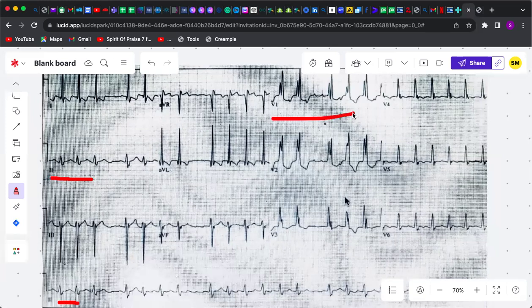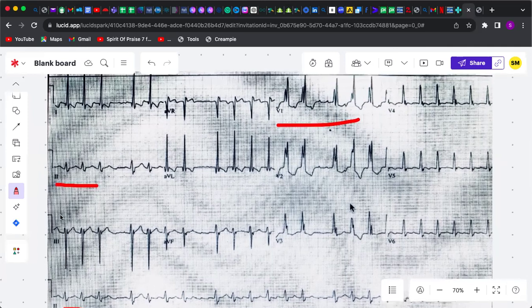So we can just see that, yes, let's look at the RR intervals. First of all, you're seeing the peaks also here, right? You're seeing the peaks here, right? Also, this is just easy to pick up.